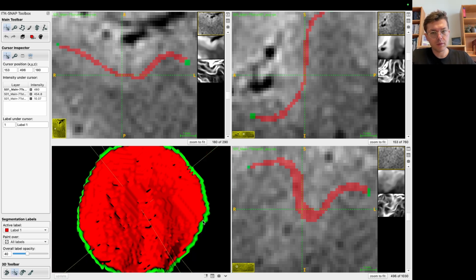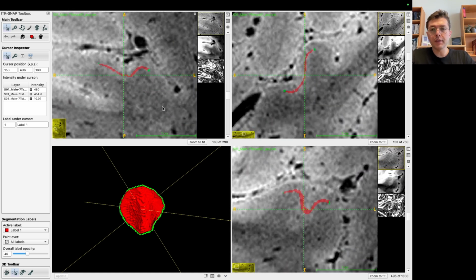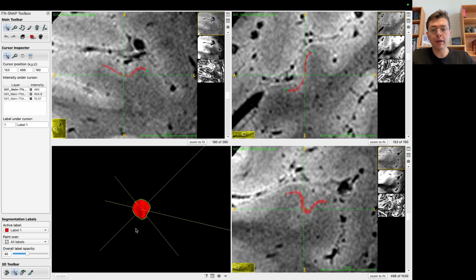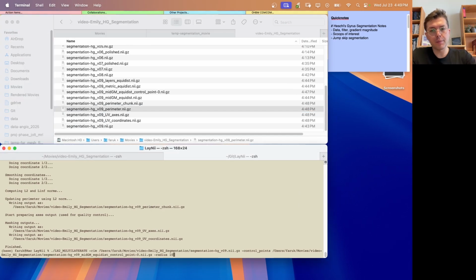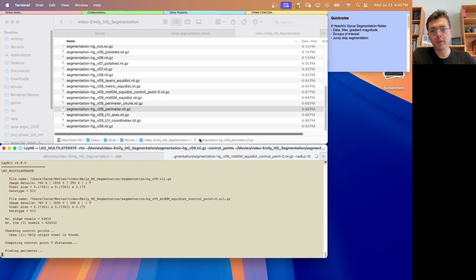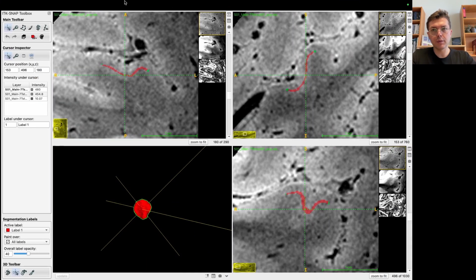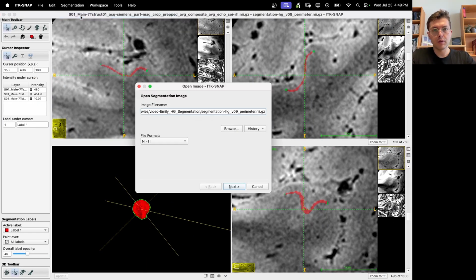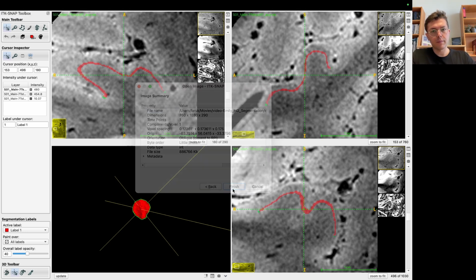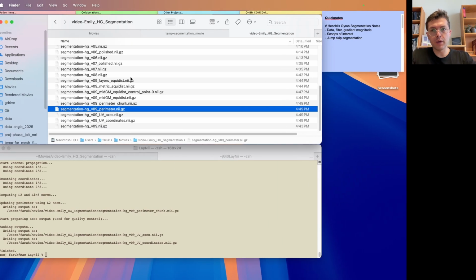Okay, now see? So this is a 5 millimeter in radius disk that is grown around the region that we delineated with the single voxel. This is pretty small. Now I'm going to increase it to 10. And this perimeter is the initial guess at the size of the disk, so I can directly load it here while the other stuff is being computed. Okay, see, now it is larger. I think I can go even larger.